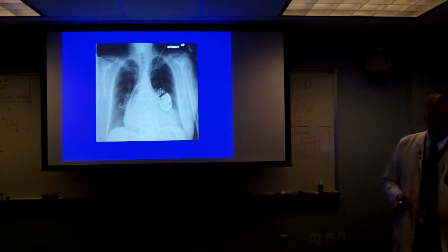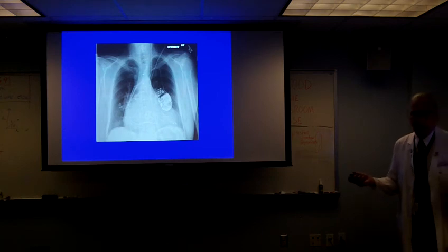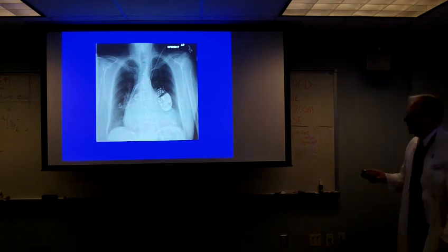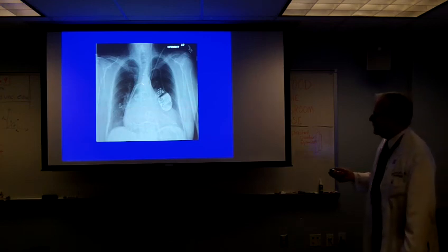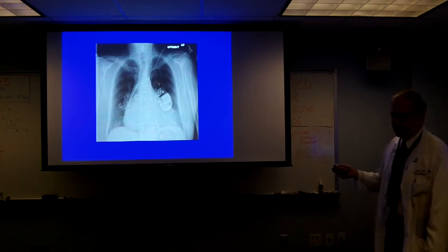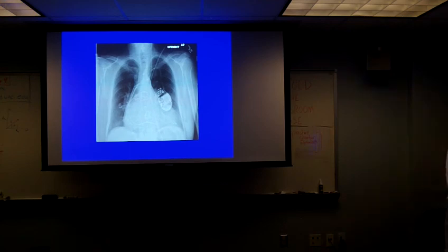St. Jude makes a variety of prosthetic valves that has no radiopaque markers whatsoever. And so if somebody gets one of those, you have to be told by the surgeon what they put in, because you won't know. But typically what you see is if these have been in for a long time, they won't be able to get them out, so you'll see a little remnant of the pacemaker or the ICD electrode where they've just cut it and then they've done the heart transplant.